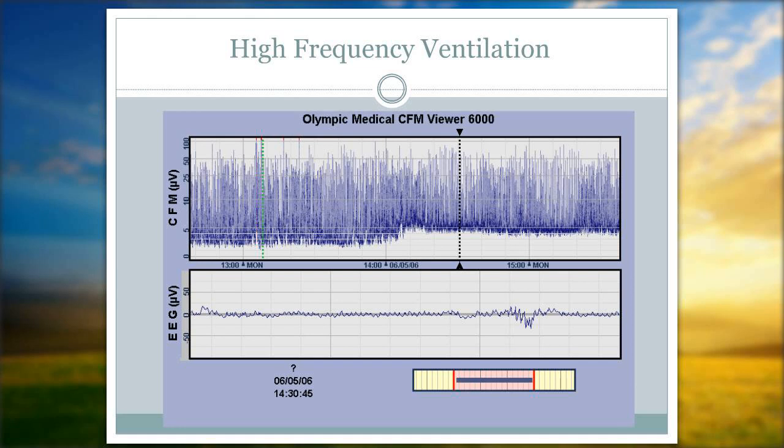The upper margin doesn't really change much. It's still this kind of burst suppression pattern that we see with our upper margin, up there around 25 to 50. But that lower margin is definitely influenced by that high frequency artifact. And that's what's causing that shift in the baseline.